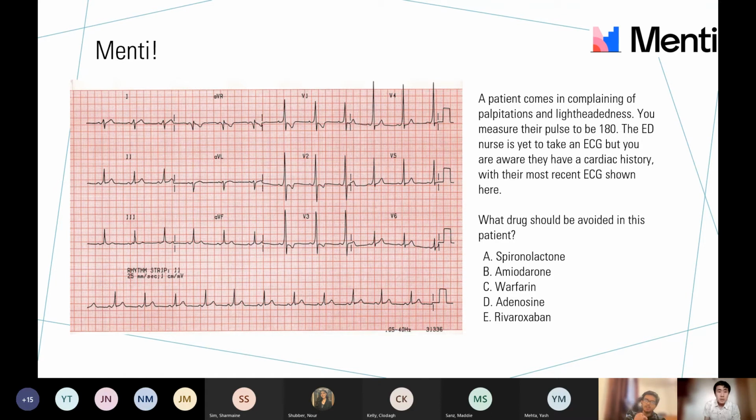Also, while you're answering that, generally a good rule is if you spot no P waves, that is AF until proven otherwise, and you should look for evidence for things that are not AF, because probability dictates that it is AF, because it is the commonest supraventricular tachycardia that isn't sinus tachycardia. But if you're really running out of time, that is the assumption you should go for, purely from a probability perspective. Very good point. Unfortunately, medicine is very much about probabilities, which doesn't often get relayed to our teaching.